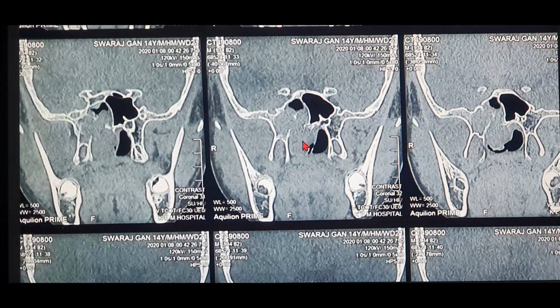So areas like sphenoid sinus, it never attaches itself to. So remember this very carefully. JNA has no attachments in the sphenoid sinus because it does not attach itself. Also, JNA does not attach itself on the nasal floor. So the entire nasal floor should be clear, the sphenoid sinus should be clear. So whenever you're removing a JNA mass, you just have to pull the mass from the sphenoid sinus. There will be no attachments whatsoever.